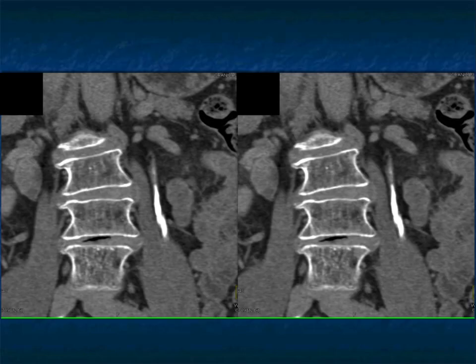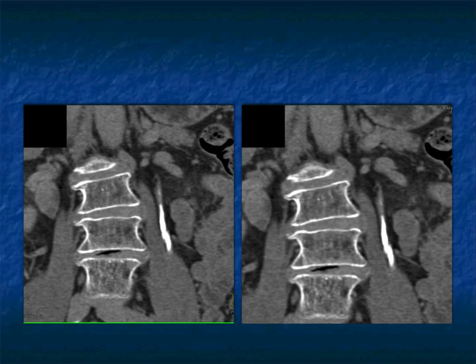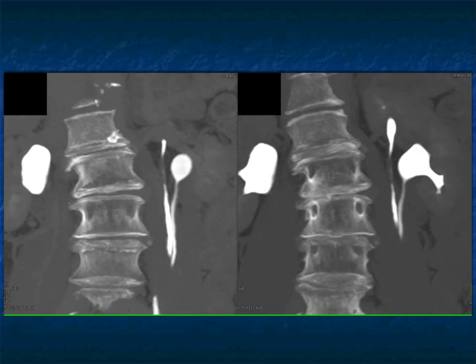Another case with ureteral involvement. And you can see the soft tissue thickening. Go back, get a delayed scan, but you have to have a high level of suspicion. Now, you can get urine cytology. Well, what happens if the urine is negative? Well, urine is often negative with TCC, often takes 3 or 4 times to get urine cytology, and sometimes you just don't get positive results. So not seeing tumor in a urine sample does not mean the patient does not have tumor.